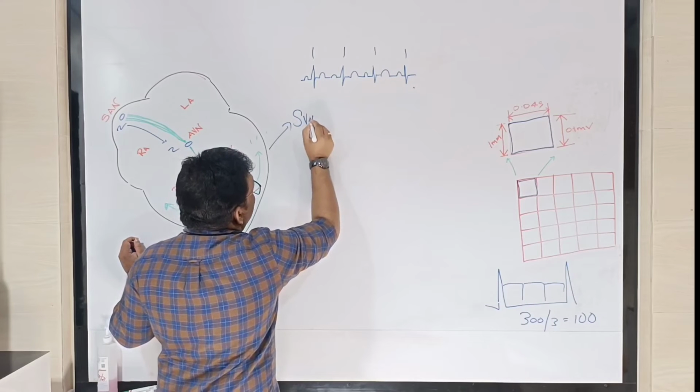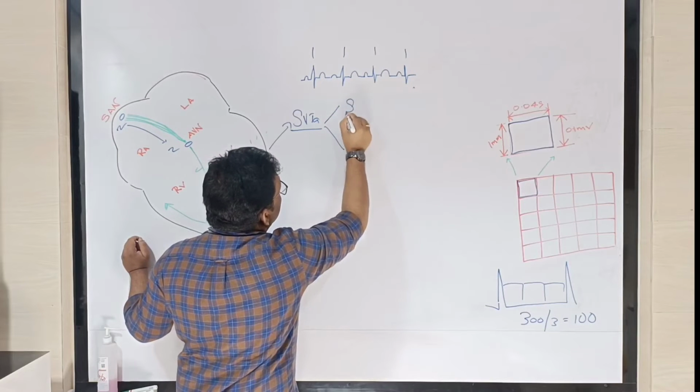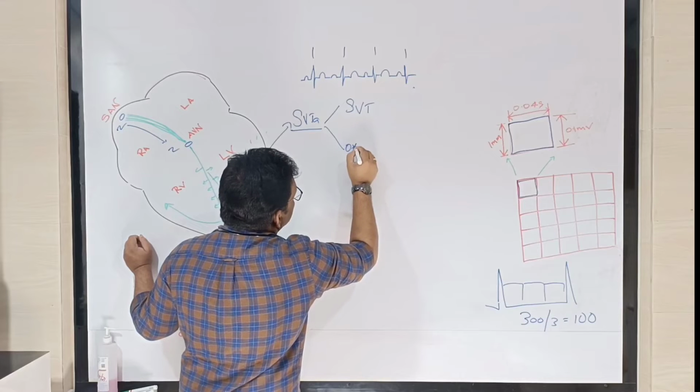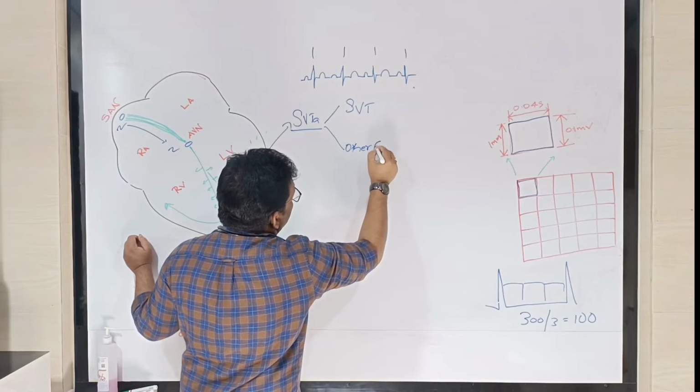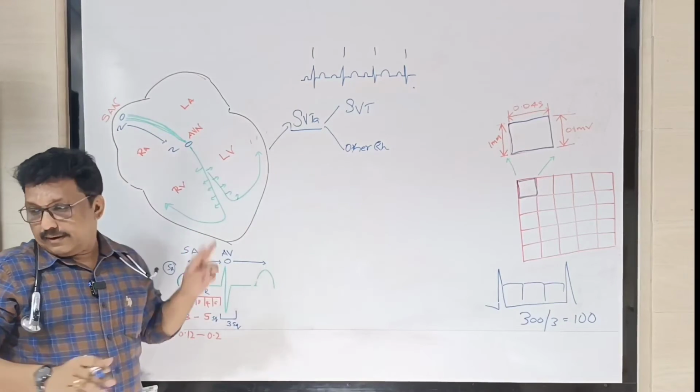Supraventricular tachyarrhythmia we can tell. Now you have SVT, proper SVT, and some other rhythms like that also you can classify. Okay, now we'll see what is supraventricular tachycardia.